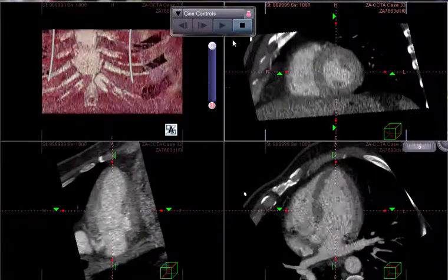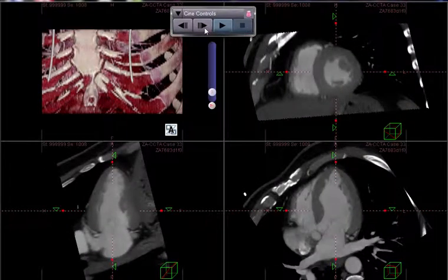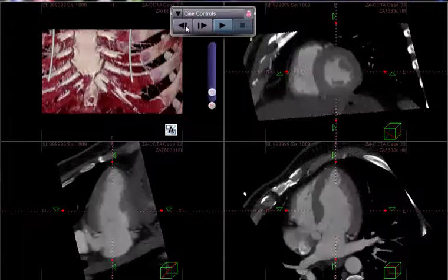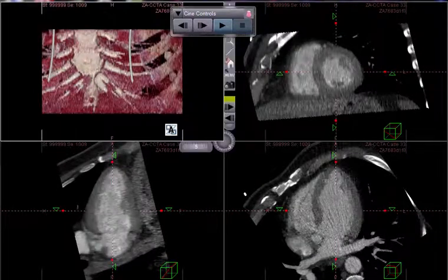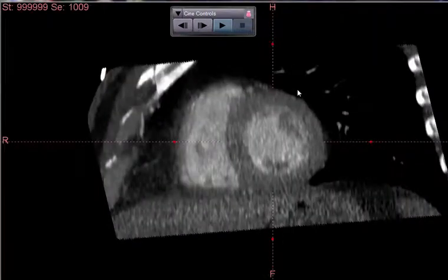Let's stop this for a second and try to concentrate on what appears to be an end diastolic phase to get a little better idea. We want to get to the largest size. Well, that looks like about that point. Let's then concentrate on that particular area by increasing the size of that and then looking at wall thicknesses. Now, this patient does appear to have probably some element of what you might call hypertensive hypertrophic cardiomyopathy, but let's take a little idea of getting an idea of ventricular wall thickness.